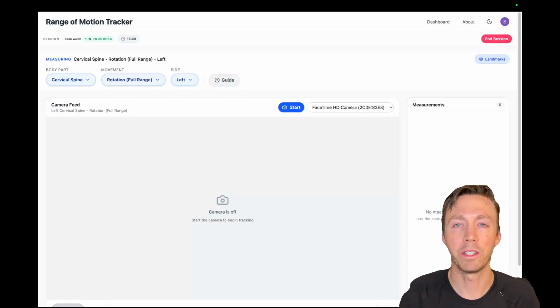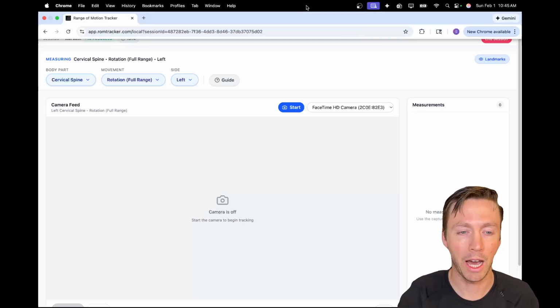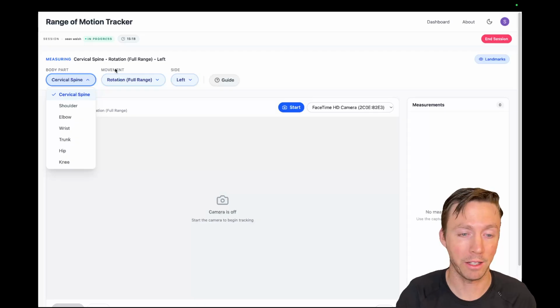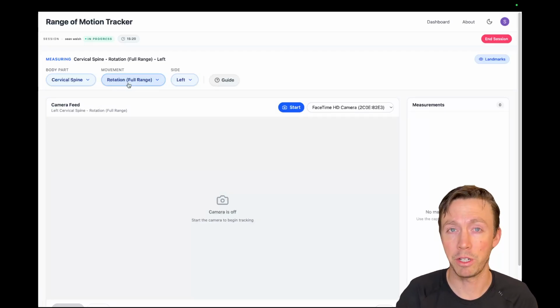Hello, this video is going to demonstrate how to perform cervical rotation using range of motion tracker software. So as you can see, I have a session going right now. I've made sure that my cervical spine is selected. Now you're going to notice that there's three different ways of capturing this. I'm going to explain how to use all three of those as well as their case uses.